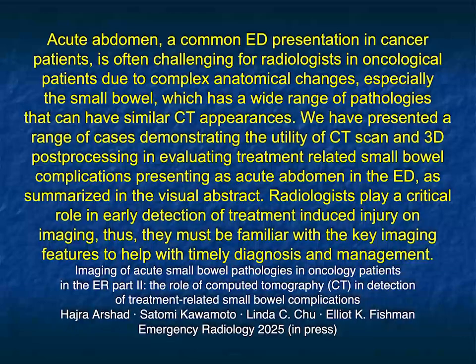In cancer patients, it's really challenging for the radiologist. There's no doubt that it's not an easy diagnosis. Again, good studies, water as a contrast agent, IV, and you can see the presence of disease in bowel. You look at other organs as well, see what's going on, but again, then trying to figure out, am I dealing with a complication that has nothing to do with the patient's cancer?